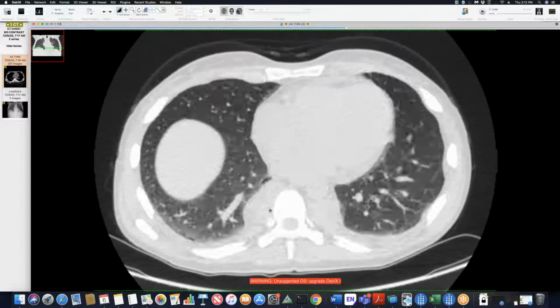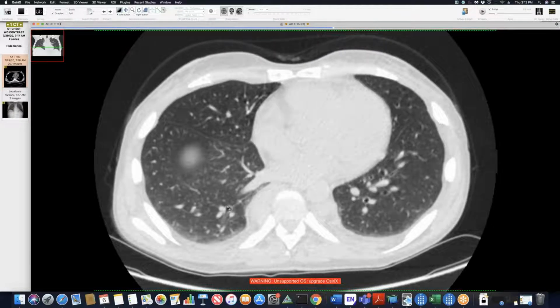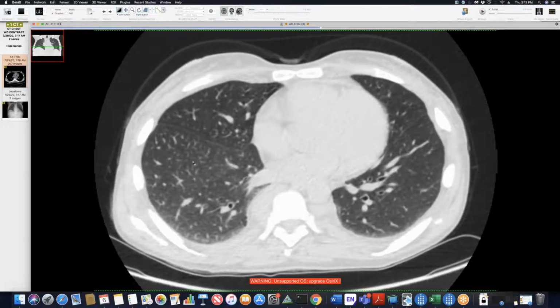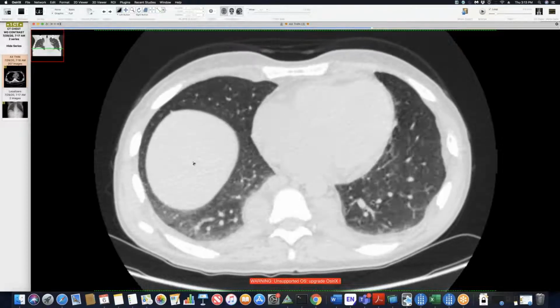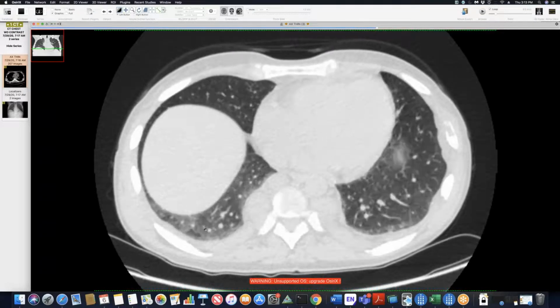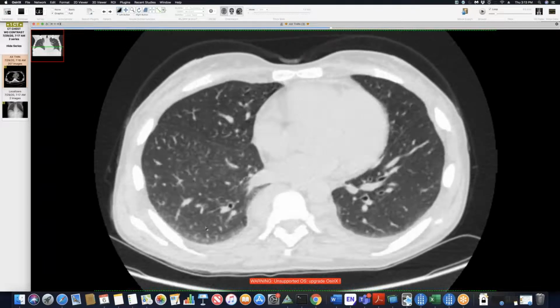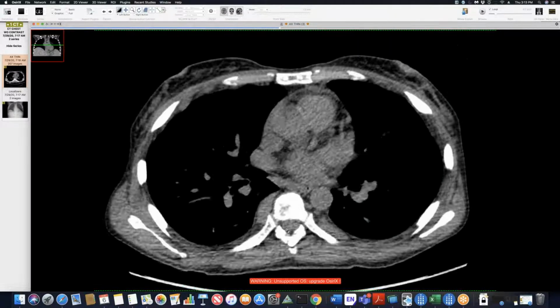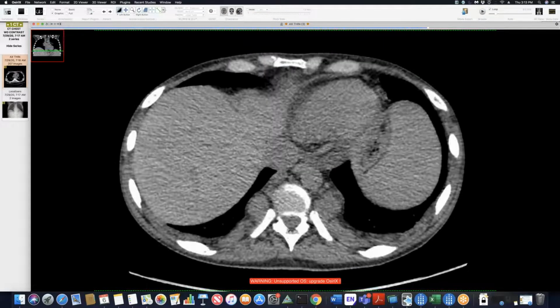And I think you guys have, I think it was Travis, somebody else may have also shown this, but I remember a case where you guys showed diffuse ground glass in the lungs with extramedullary hematopoiesis, also in the lung parenchyma. I think this is most likely just atelectasis down here. It's not severe enough to be that. Just a good example of extramedullary hematopoiesis in the setting of myelofibrosis.